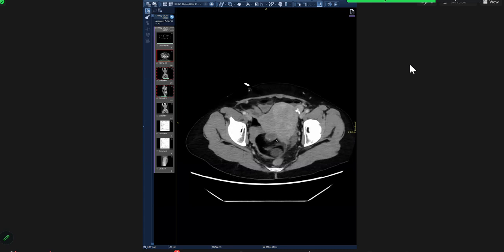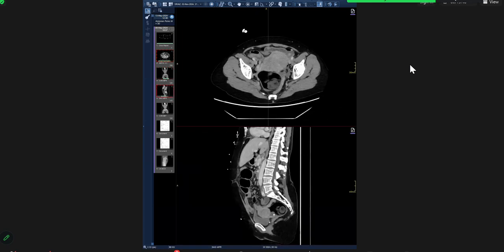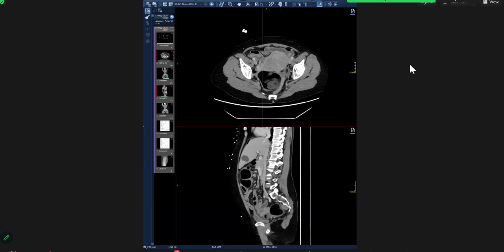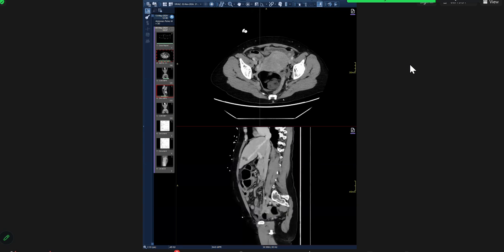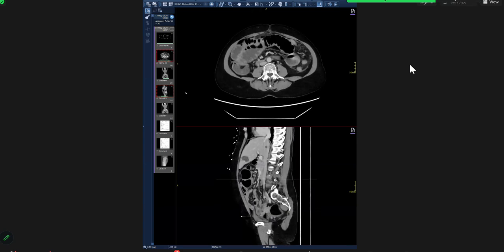I showed you the coronal image because I wanted you to see that the rectum is here. So you can make out that this is the rectosigmoid, and you know that this is an obvious pelvic mass. You didn't even try to comment on it. Then why should you see all this fat here? There is diffuse rupture and there's fat all over, and this is what is causing this ileus. And the patient had severe abdominal pain.